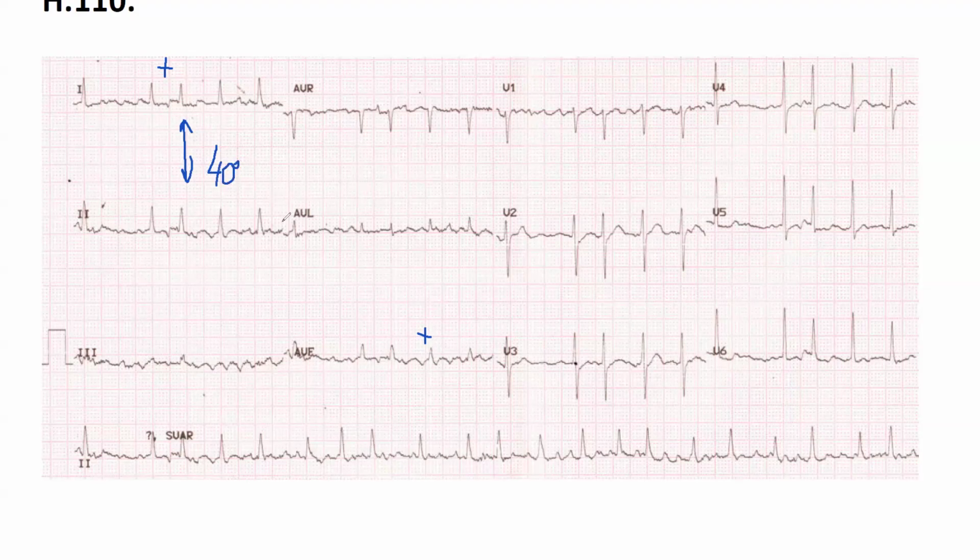All right, go on. So next, pathological Q wave. I don't think I see any. No, neither.